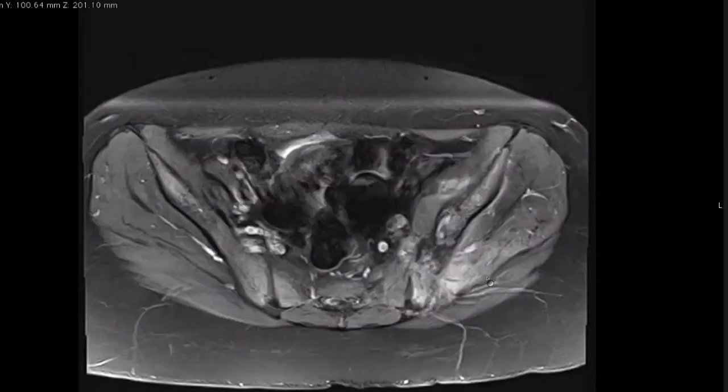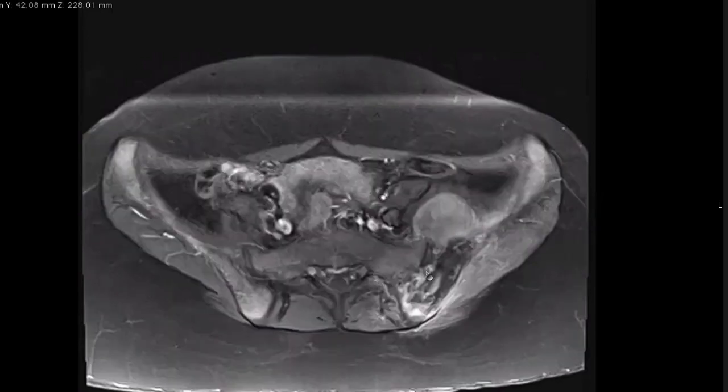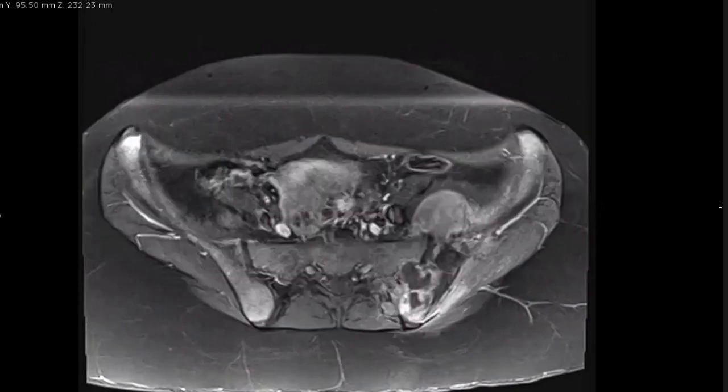This could be TB, that's the other thing, but TB would seldom give you this kind of a large lobular soft tissue mass. But in that age group, you have to think about Ewing's or TB. These are the two things. And it was biopsied and it came back as Ewing's. All right? Yes, sir. Okay.